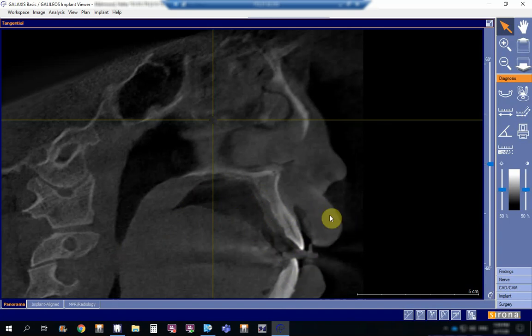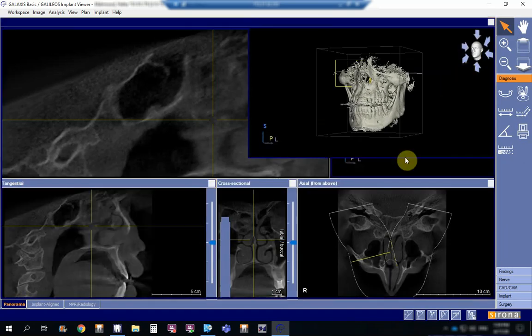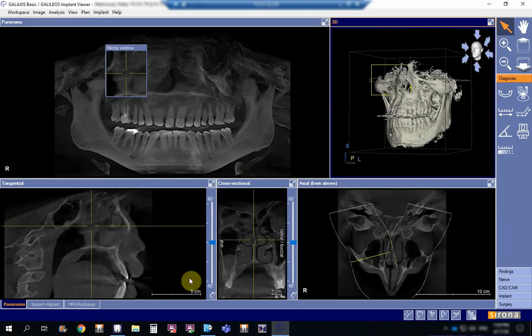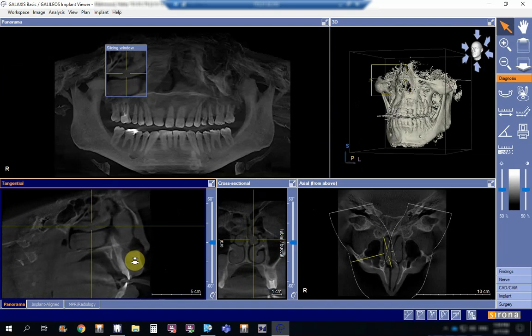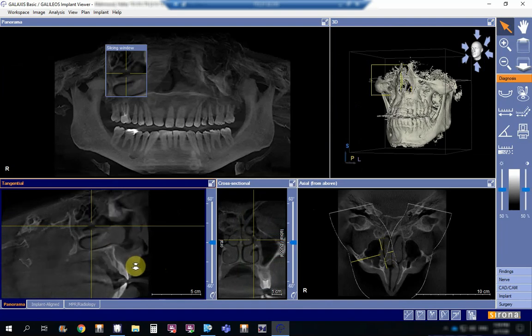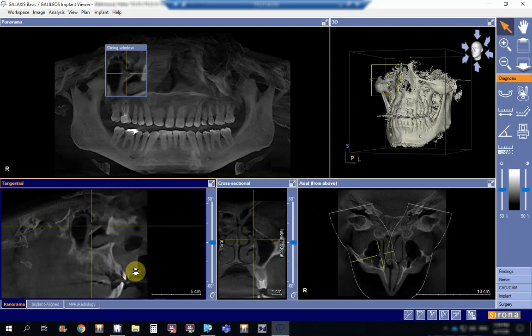Lip, upper lip, lower lip, and part of the shadow, and these are the nasal bones over here. This is the maximum we can get as we go medially. If we go more laterally, then we are here in the conchae, and then we go out.